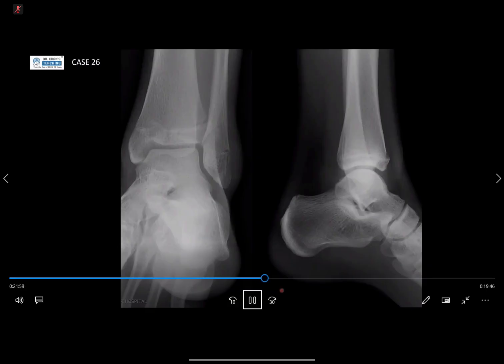Yeah. So I think it's a point just to make that when you're reporting pediatric films, just take a close look, drawing all the contours. And any lucencies, you should be able to define it. And if you can't, look at Keats first to make sure it's not a normal variant, and then after that you can explore the other differentials.